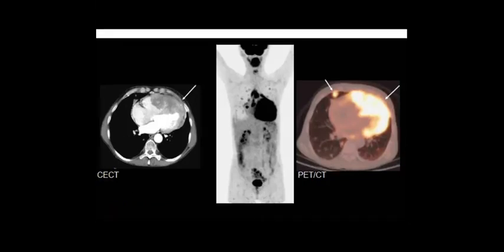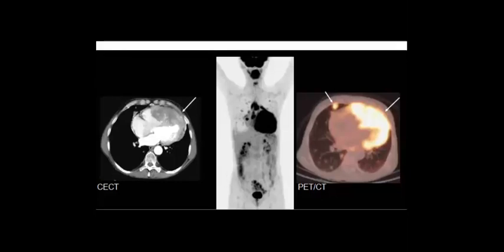Okay. So again, a tricky case. It's not an easy one, but it can happen, as in this case. Let's shift to another.